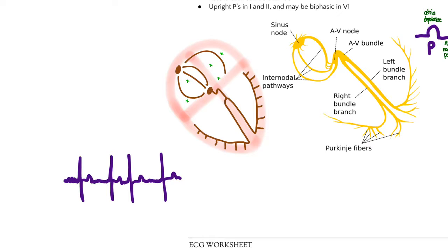So what are we seeing here? It's a couple of things. Number one, there are no P waves, right? Because we knew that it wasn't following this standard conduction through the SA node and through these pathways. We're also seeing that these are not happening at regular intervals, right? Some are further apart and some of them are closer. And we knew that was going to happen too, right? Because some of these were further apart. This is going to take longer to reach there because we know that it's not taking the superconducting highways.